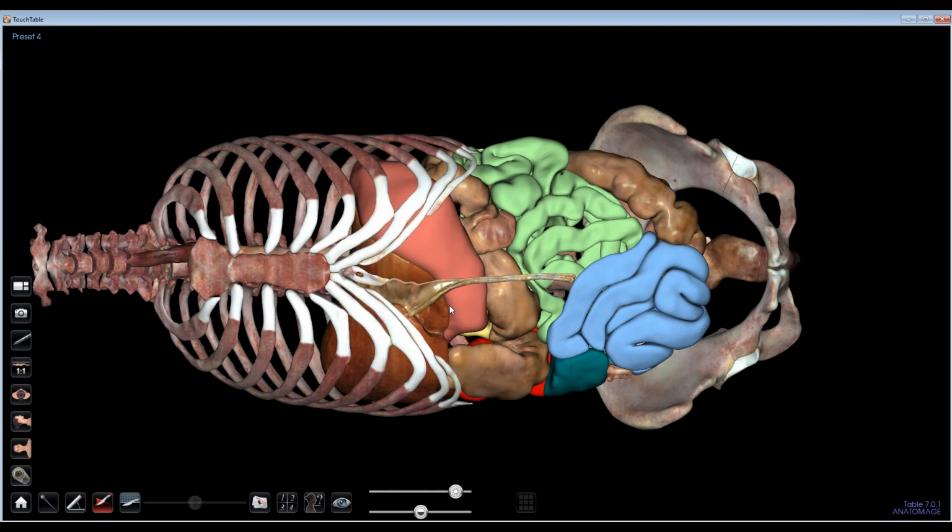So for the most part, you can't create these or view these outside of the table software, but we have a couple of these other applications that you can potentially use for that purpose. So Table on Cloud, which is the full table software, cloud-based version, or a limited light version of Concourse that requires you to download it and install it locally on a computer and run it off of that. The only issue with Concourse is you'll need a little bit more of a beefy computer than most generic laptops that you have.